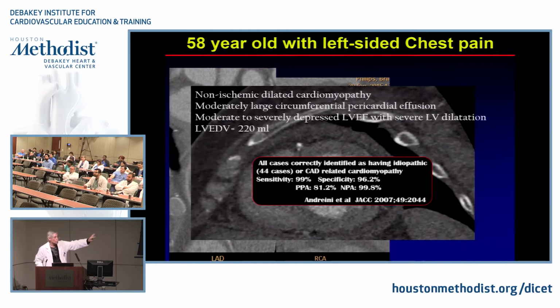Because honestly, with nuclear, when you get a lot of these regional wall motion abnormalities we showed in the last case, there are so many variables that go into why someone might have a perfusion abnormality. Besides attenuation artifacts, you have the partial volume effects, which we already talked about. And then you're left with, I think it probably is. But how does that help the doctor? Wouldn't it be better to be categorical and say it's clearly not? Yeah, absolutely. John?